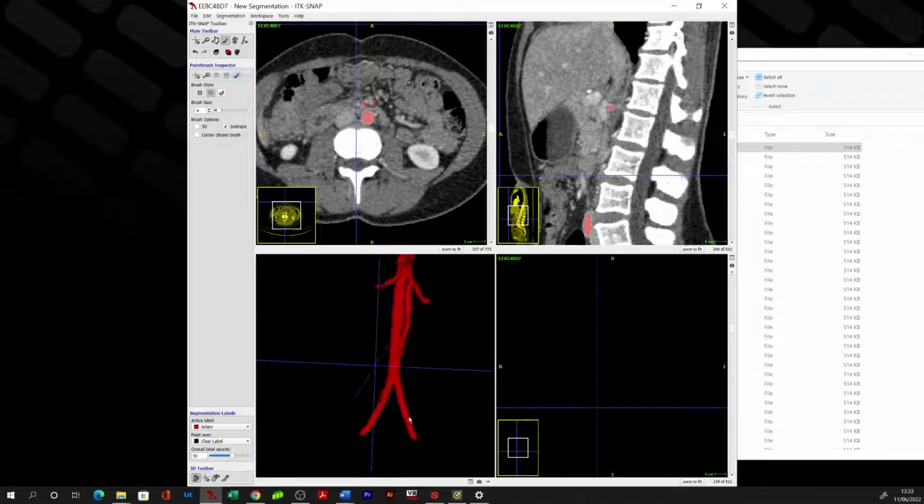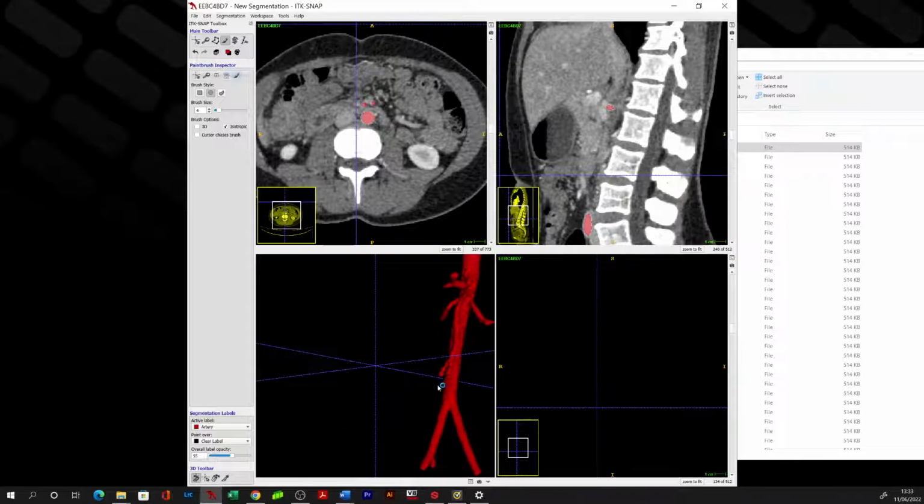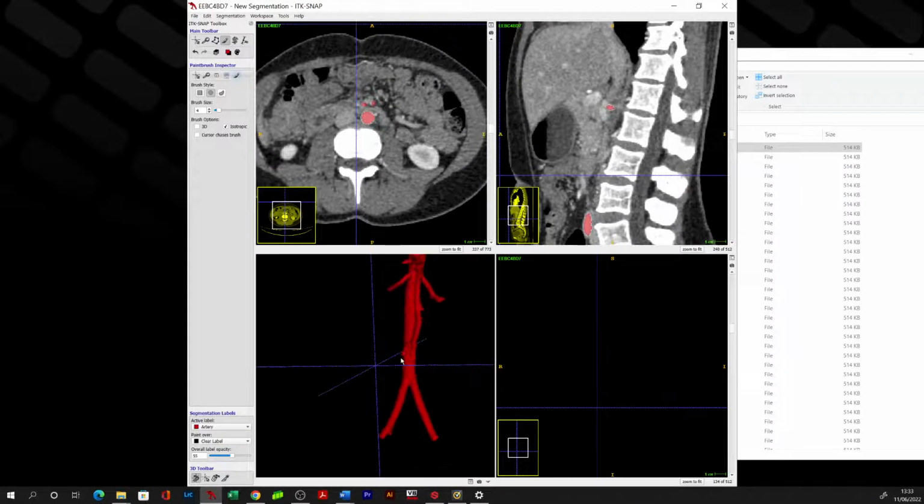But you also have the luxury of seeing how this is all emerging, and you can start to get a sense of things. The first question you can ask yourself is: is this anatomically possible, yes or no? And then you'll also get a sense of what looks right based on your experience of doing multiple cases, but also seeing the operative findings.